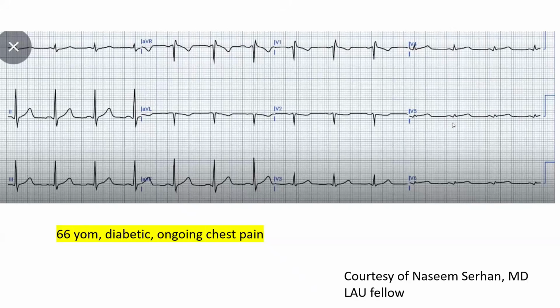If you have serial EKGs, you will see the QRS progressively shrinking in size and eventually evolving into a Q wave. If you are looking at only one EKG in time, QRS shrinking usually means to me a QRS that is small, less than 5 to 10 millimeters, along with a T that is large in relative terms, meaning it approximates the height of the QRS. Not necessarily the exact height of the QRS, but close to it.